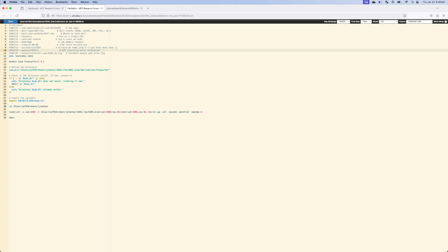And if we were just doing 1 CPU per task, you wouldn't have to worry about this. You could get rid of that -B, and it would be a sort of normal priority job. And then the output, this is going to be a log file that's saved in the current directory, wherever you run this. And I'm just going to put in that whole ID again on it.